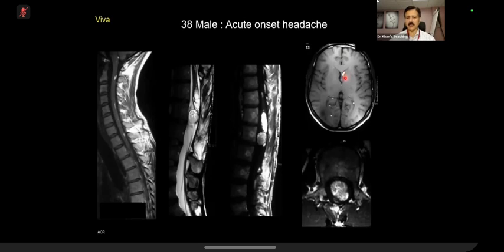On a CT scan, it becomes more difficult because it will be low density, lower than the CSF, and you will tell the examiner that it might be air also. Air is also an exam case, right? So you do the densitometry. And in this particular case, even here, you can see the same thing.